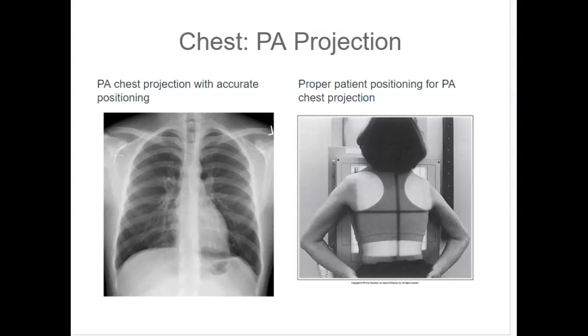Distances from the vertebral column to the sternoclavicular ends should be demonstrated as equal. The lengths of the right and left corresponding posterior ribs should be equal. The mandible should not be demonstrated within the exposure field. The clavicles should be positioned on the same horizontal plane. The scapula are located outside the lung field.